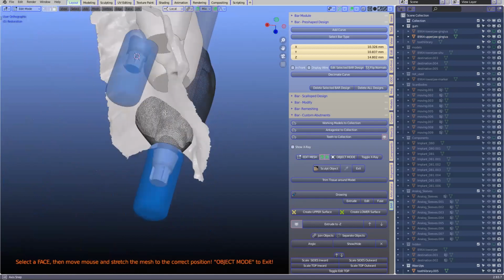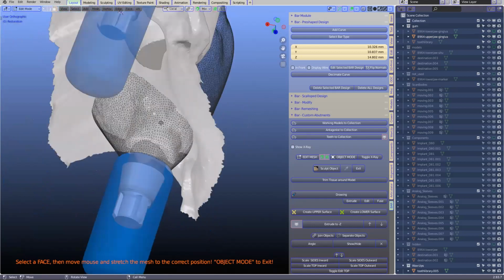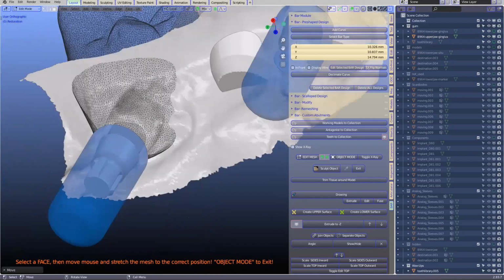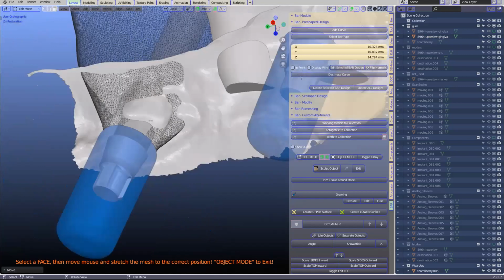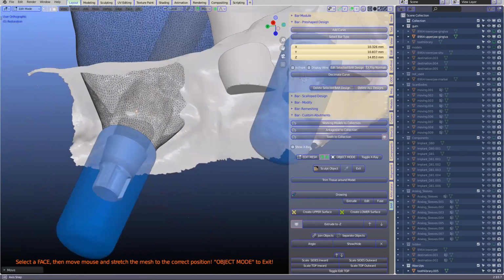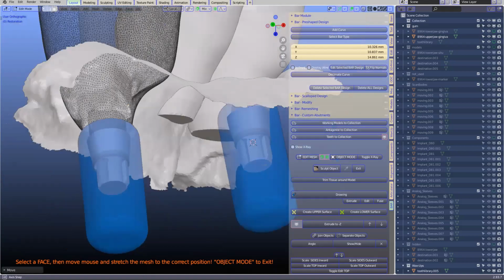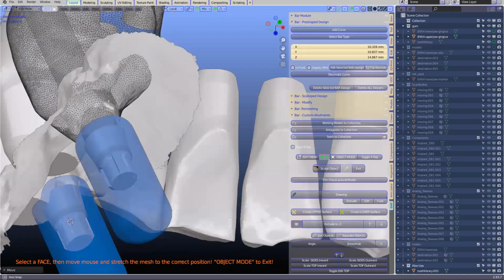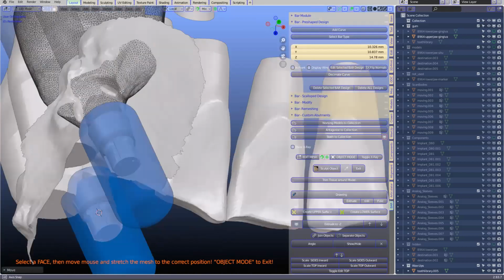is on, and then you can just click on here, use the G key, and you can actually make it adhere to the actual canal of the transmucosal extension bit. Yeah. So what I've done is I've just put it in like that. So we can do quite a lot here.